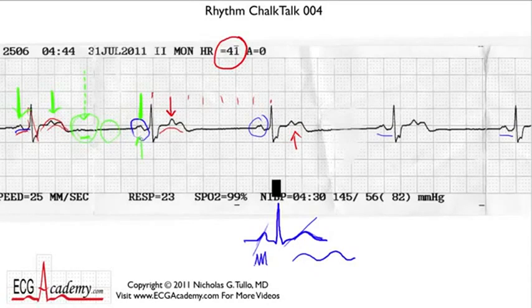before you came to this P wave. So neither of those cases are true. So what is this then? How would we classify this P wave superimposed on the T?